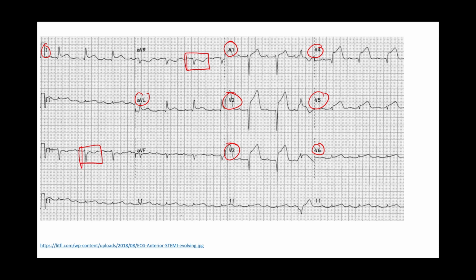Let's talk about the ST elevations first. The ST elevations are present in the septal, anterior, and lateral leads. Essentially, it's involving everything on the left side of the heart. The likely culprit here might be a left coronary artery or left main coronary artery occlusion.